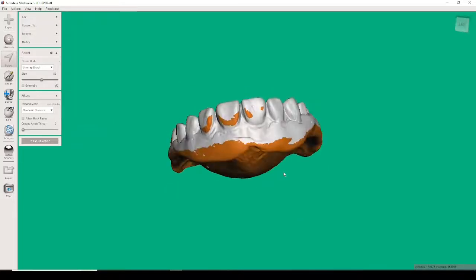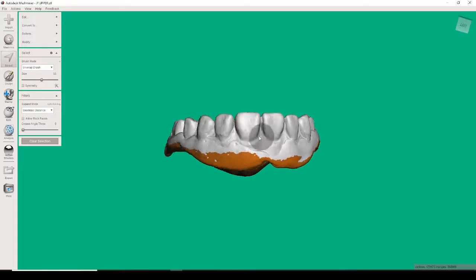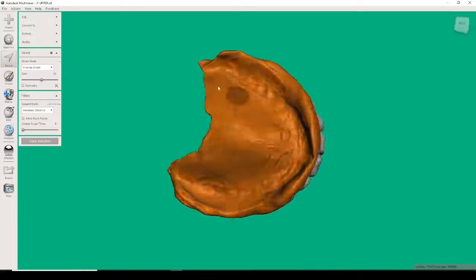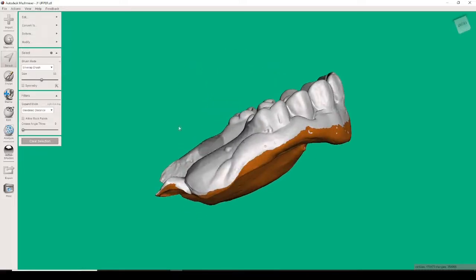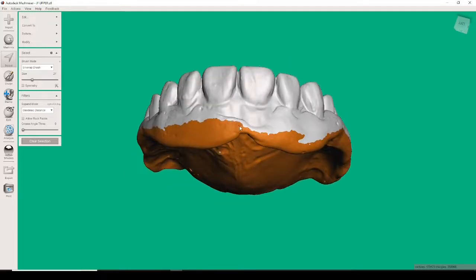So in order to do that, I need to first create a model to set the teeth on, because I'm going to be changing the position of the teeth. I can't simply use a duplicate denture technique. So what I'm doing here is I'm using Mesh Mixer to highlight the areas that I'm going to later on invert and make a digital intaglio surface model from that.